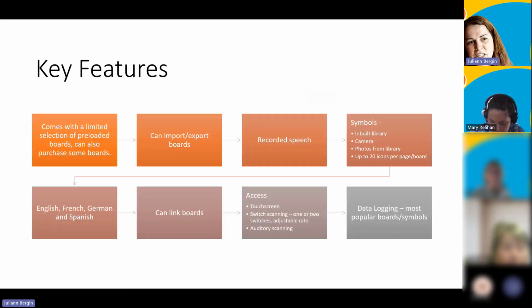It comes with a selection of pre-stored boards on it. These are a little bit disjointed, I'll be quite honest. I seem to have thrown together a few just to demo the app. You might find them useful though in certain situations, but what I tend to end up doing is making personalised ones for the people that I'm working with. These can be quickly done, you'll see today, very easily put together, and you can very much personalise them to the individual's requirements. You can also purchase some boards.